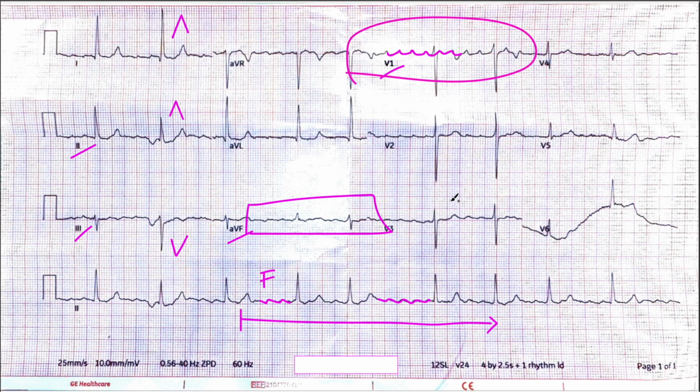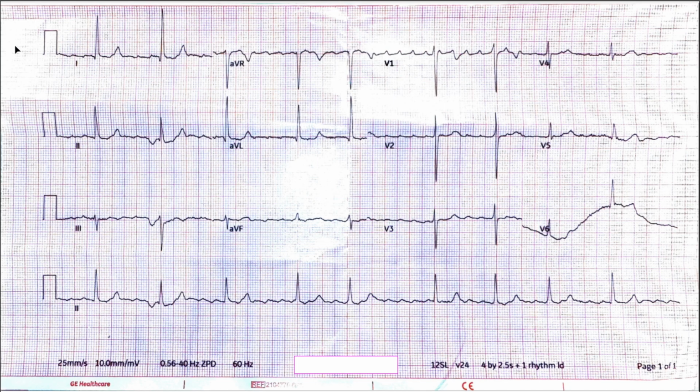So if you were to hand this sheet of paper over to somebody or put it down into your system as far as what your analysis is, what I would write on there is atrial flutter. Remember AFL, right? Atrial flutter. We have a slow ventricular response at 54 beats per minute. And in the deep dive video, I'm going to be going into why 54 beats per minute is a little bit concerning and what you would have to do to make sure that you can leave this patient alone.